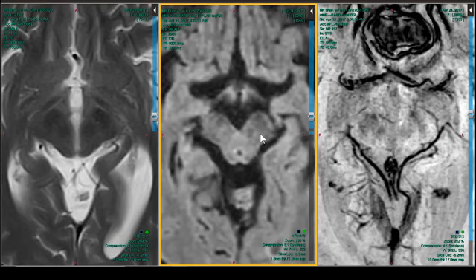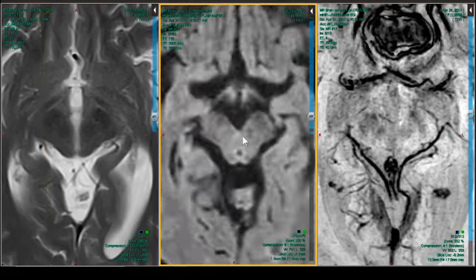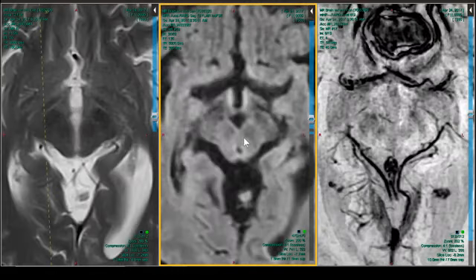So that's a really important diagnosis, because if the patient has MSA and you treat the guy surgically, that's not something you want to do. So we looked at the brain iron, and I tried to show you a couple examples earlier of the zona compacta stripe, the substantia nigra, the red nucleus.